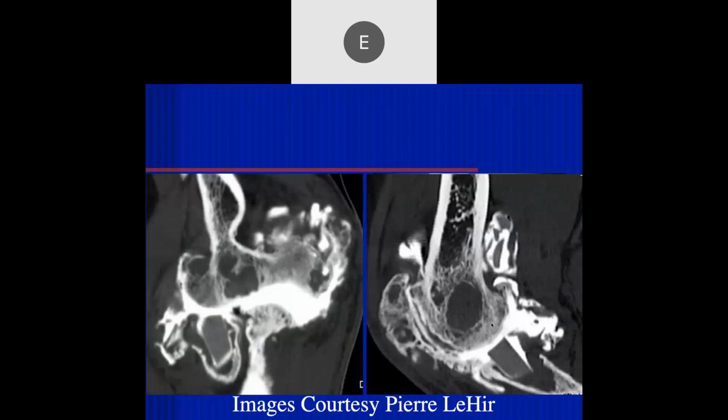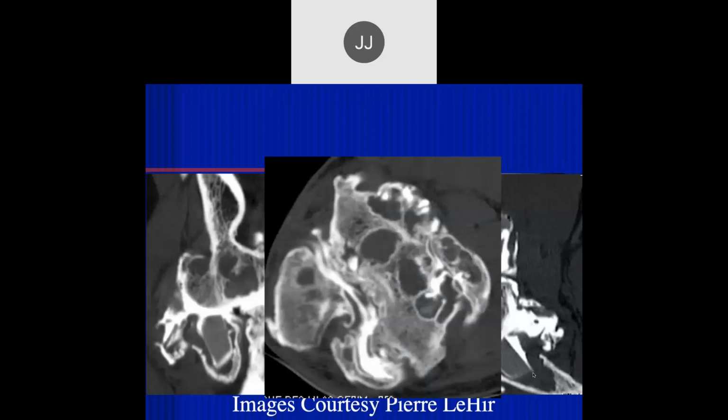What catches my eye is this structure by the radial neck. What's that thing in the radius? Was that a prosthesis? Okay, good. And then I can see all these cystic changes, all these marginal osteophytes, and this is a case of silicone synovitis from an old silicone prosthesis that basically broke and was in there. They used to be used in the old days for recalcitrant rheumatoid arthritis.